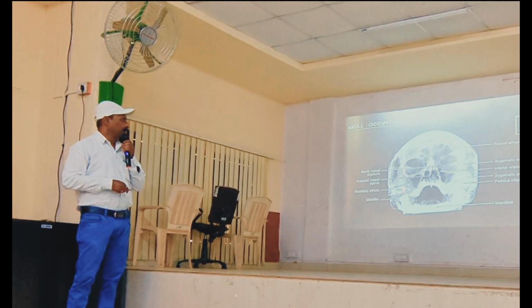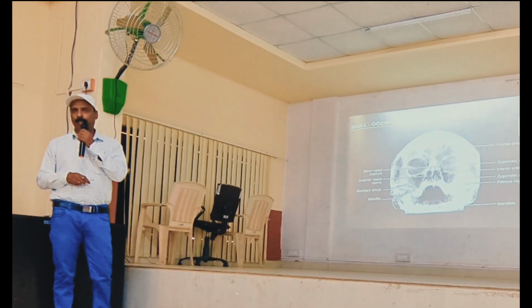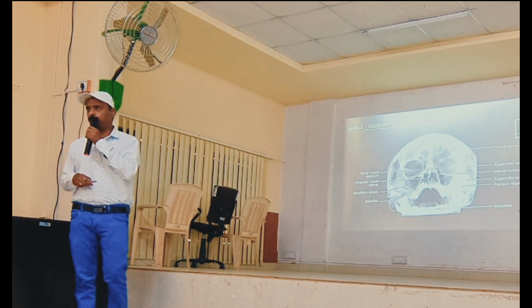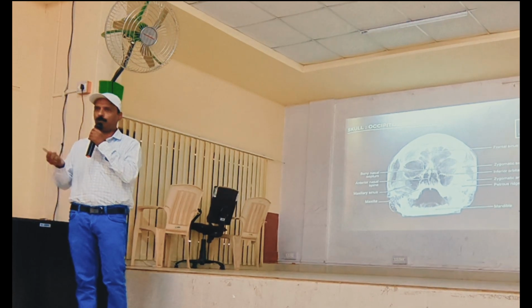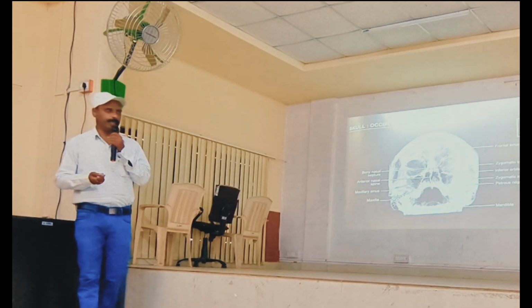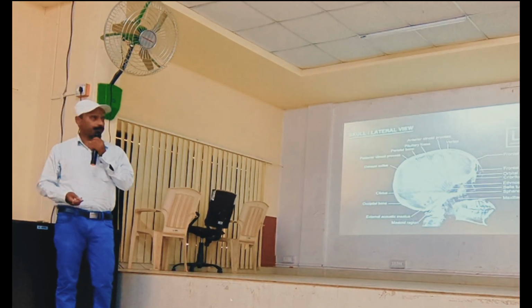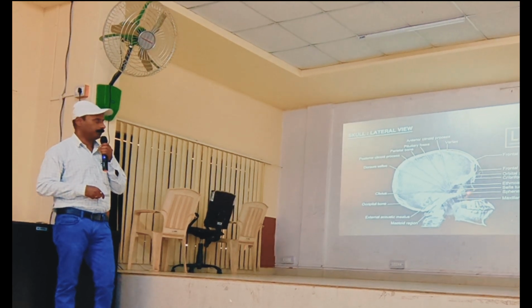Next. This also is to see the deviated nasal septum. Nose applied anatomy where the nasal septum is there. Here we are going to get the nasal septum. We want to see, diagnose. In that we take the extended head anterior posterior view. That also you should remember. That is which we can take the plain X-ray of head, on the occipital-frontal view, on the PA. This is also lateral, as I have shown in the first X-ray of skull.